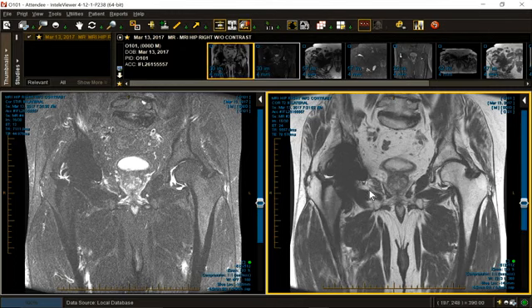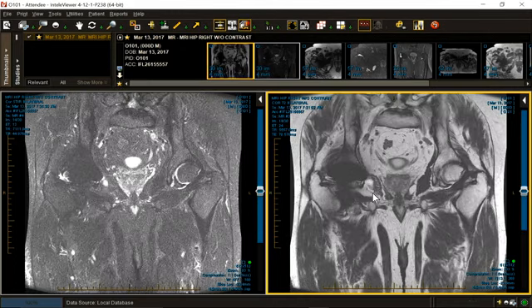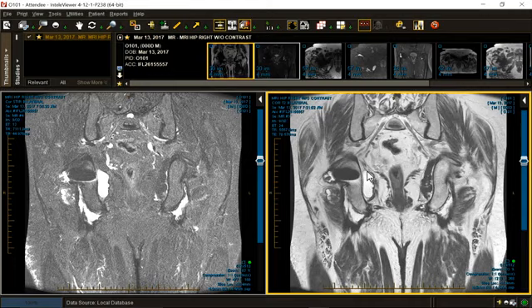Stay with fast spin echo and T1 imaging, and your goals are simple. Look for proteinaceous effusions and see whether they contain particulate material. Let's keep it simple. What type of particulate material? Well, if it's a cemented prosthesis or it's a ceramic, then that particulate material is not going to be metal. It's going to be more intermediate, and it may induce a synovial hypertrophy.